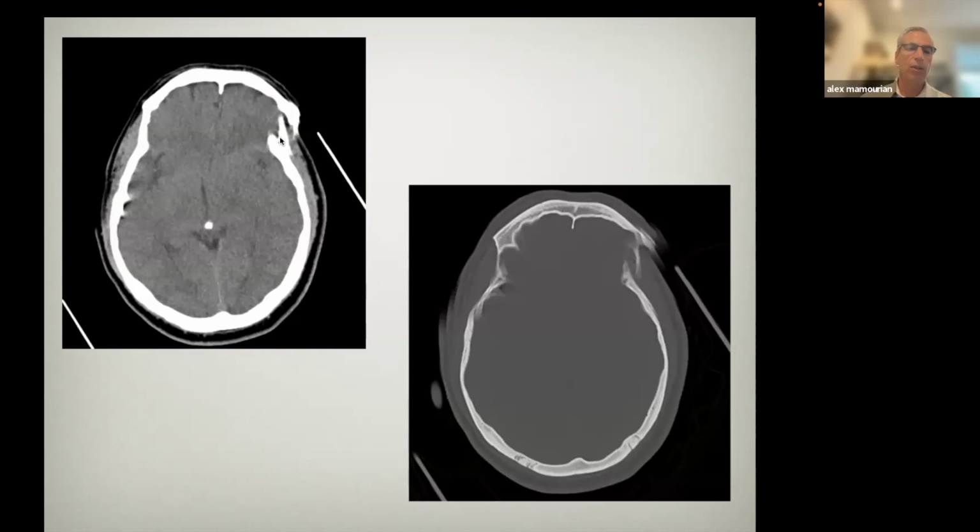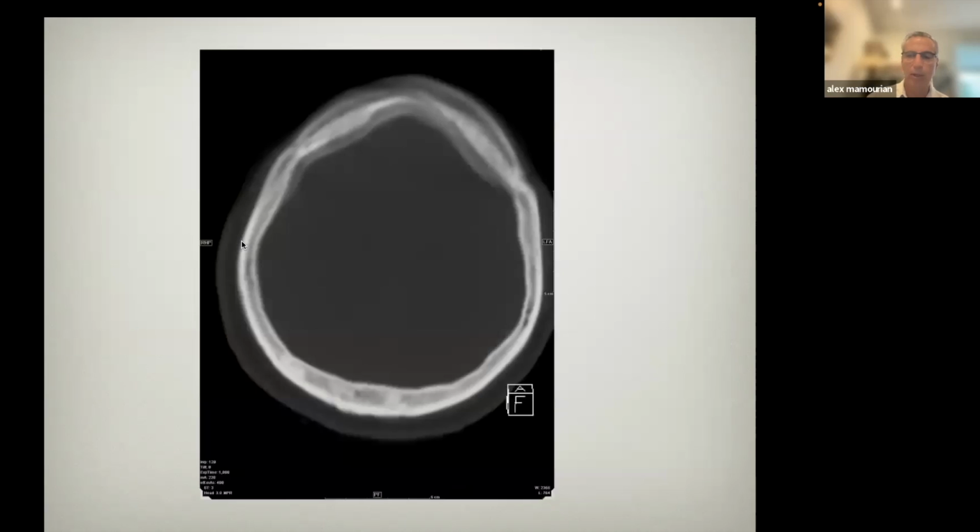So here's a patient that looks like there's malalignment of the skull here. And this is just a motion artifact. You can see some of the blurring that occurs here. So how did this happen? The scan data was probably acquired in a helical fashion. So on the reconstruction, there was motion at some point and non-motion at another point.